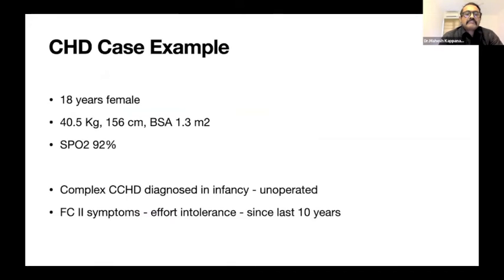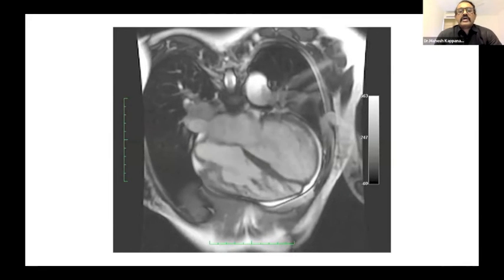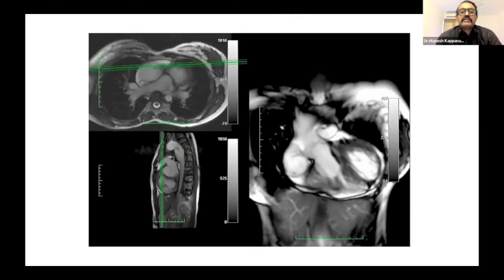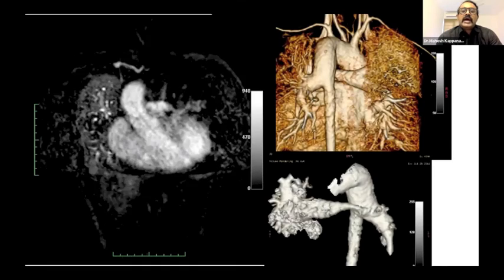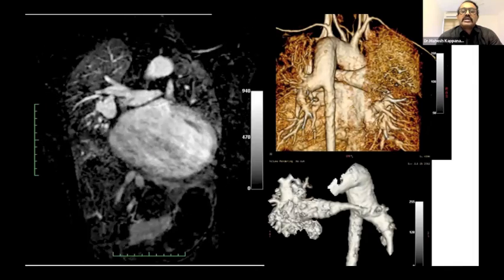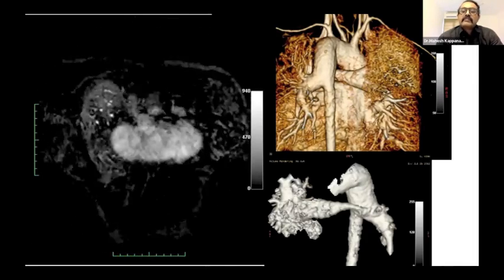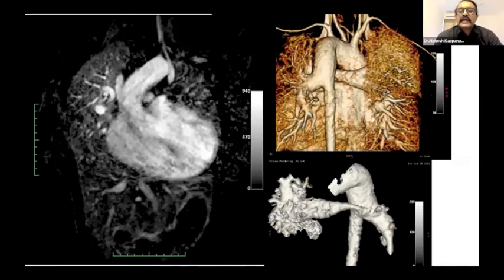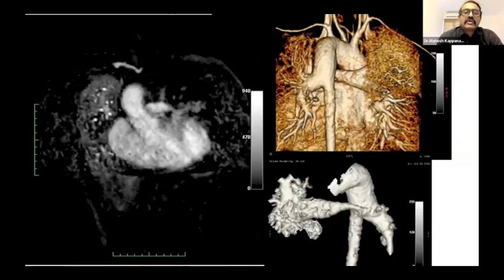This is an 18-year-old patient probably similar in characteristics to the patient in the question, where we are able to see a comprehensive anatomical assessment of this patient having a single outflow, and the angiogram showing that the patient has MAPCA-derived pulmonary blood flows with a MAPCA going into the right lung being stenotic at its origin, and a MAPCA going into the left lung being unrestricted.